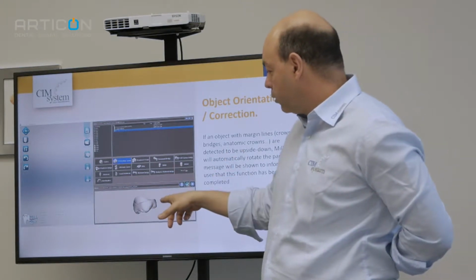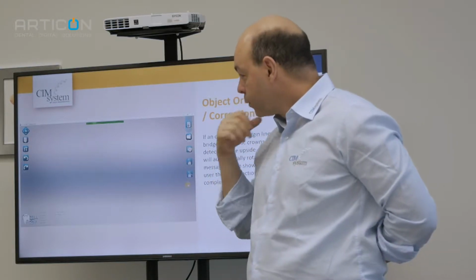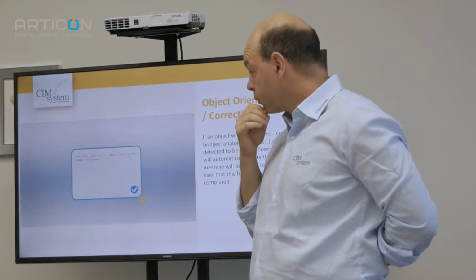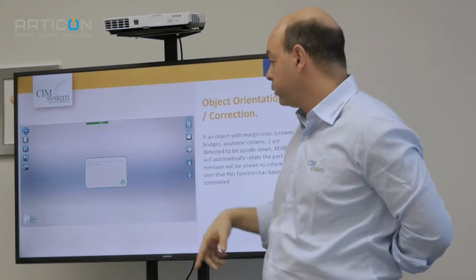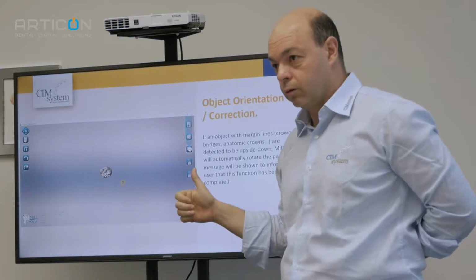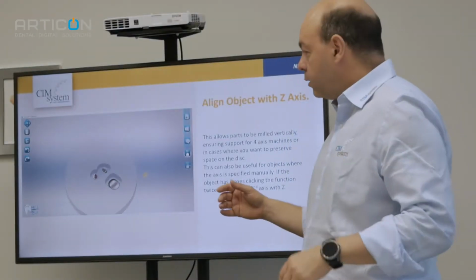Look, I click OK. I get a notice: the orientations are wrong. The imported object is rotated 180 degrees. When I confirm, it is automatically rotated into a good position. Okay, this is the good news.